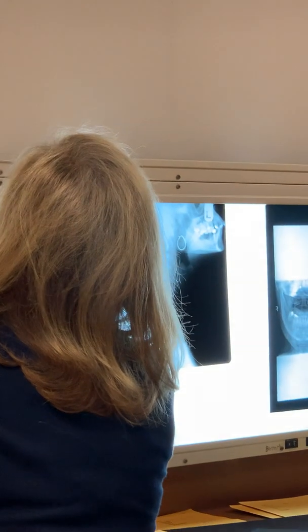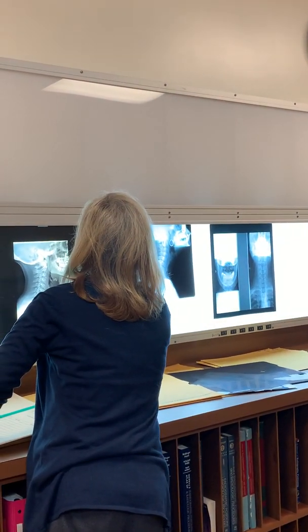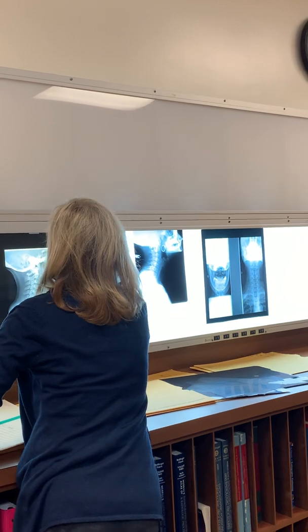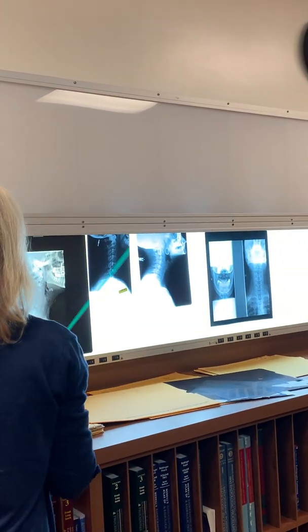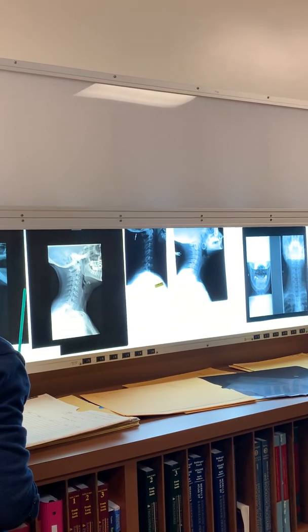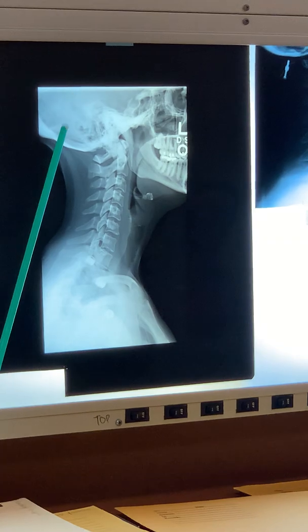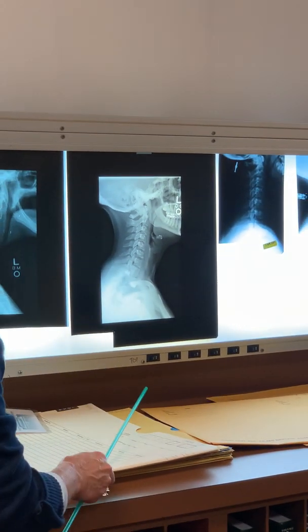Oh, I see another one. That's weird looking. Sorry to go back. What is this thing? What do you guys think that is?